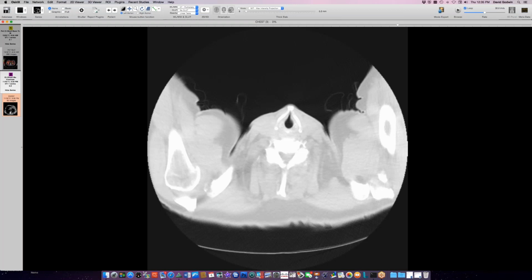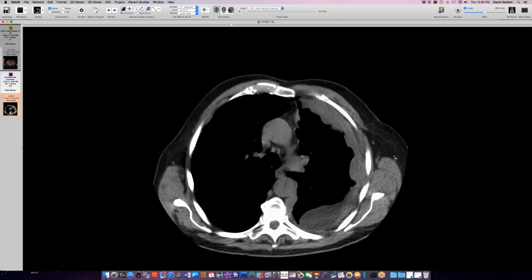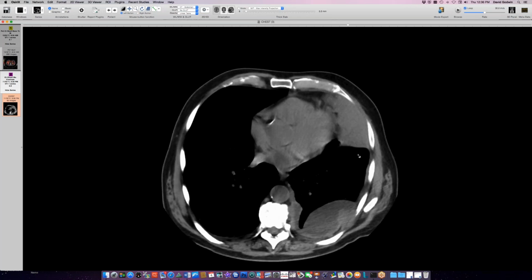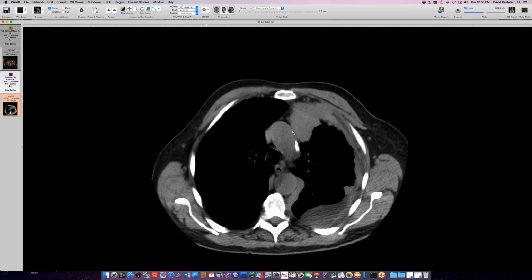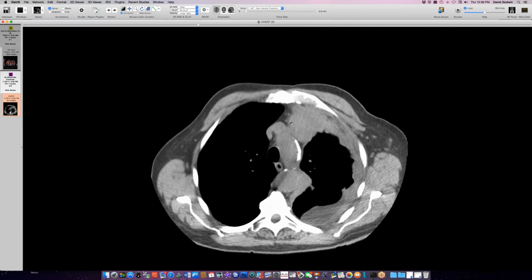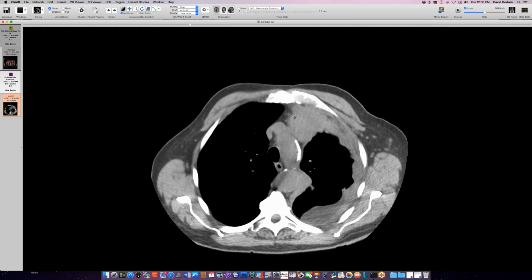I think you'll agree that this is abnormal. This person has this widespread pleural tumor with some nodules and some loculation of effusion associated with it, but it's circumferential. It's probably going into, or at least abutting, perhaps going into mediastinal fat anteriorly, which mesothelioma loves to go into, this anterior mediastinal fat. So when I see that, I think, this is definitely mesothelioma consideration, strong mesothelioma.